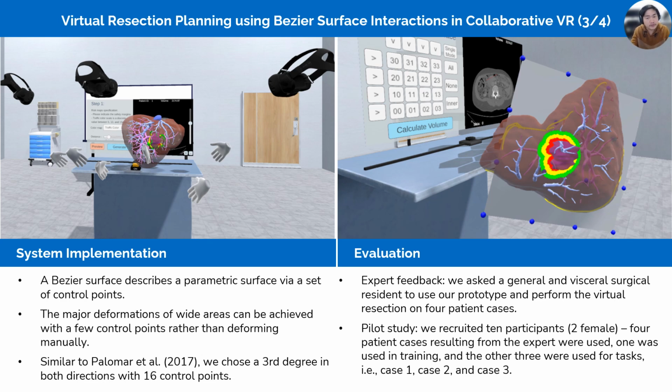The session was conducted remotely in our collaborative VR environment. The expert joined in VR from the University of Mainz in Germany, while the investigator joined from the University of Magdeburg. The expert tested both interaction techniques, the Bezier surface and the deformable cutting plane, and the final configuration of this resection planning was saved.